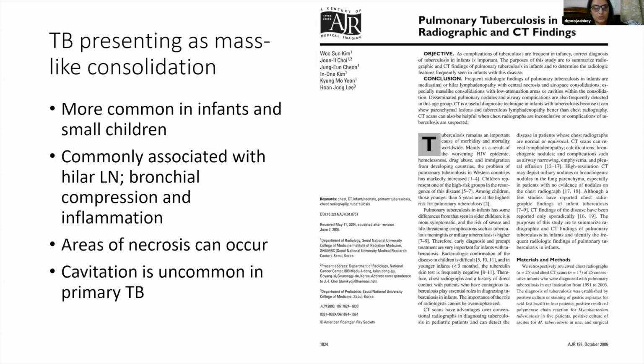We've seen larger children as well. Though the literature says that this is more common in infants and small babies, we have now seen it in older children as well. So it's important to correlate with the clinical duration and the clinical symptomatology. Subsequently, the history of TB contact was also taken. This child had a positive history of contact as well.